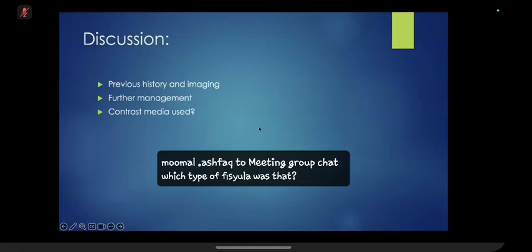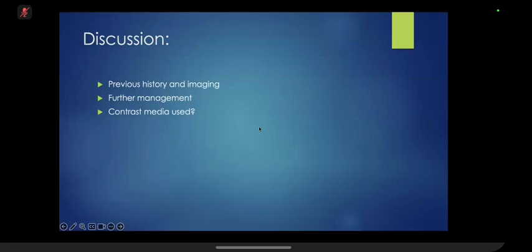There is the cobra head in the left image. That was just the gas bubbles. Because when the baby drinks milk with the feeding bottle, there is some kind of gas bubbles you will see on the films. Okay, again and again, I'm getting requests for malrotation.